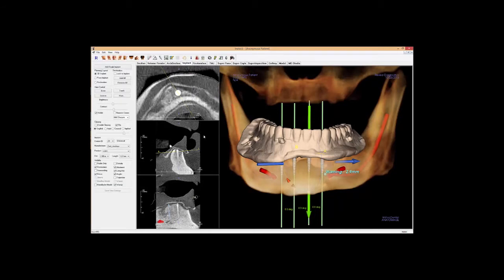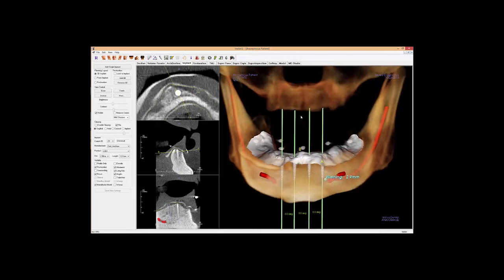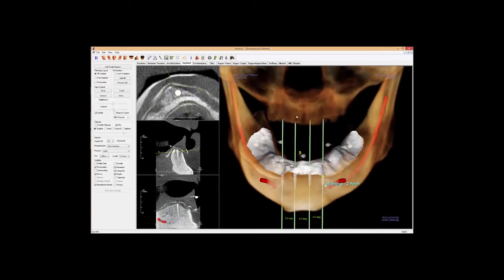So when we go back into the implant tab, we can really see this outline here, this green outline, is what Anatomage is using to line up that denture. And if I change that, you'll see this green outline now with the stone model overlay. And now as we go through the scan, you can just go through mesial distal and just see how well does that line up. And if it's a really good fit, then you know, yes, all of my tools are well calibrated. We have good impressions and good models. And you can be pretty confident that the data you're presenting in Anatomage is going to be as accurate as possible, and we're going to get a really nicely fitting guide.